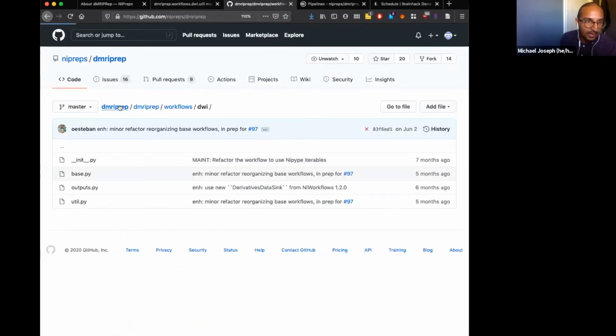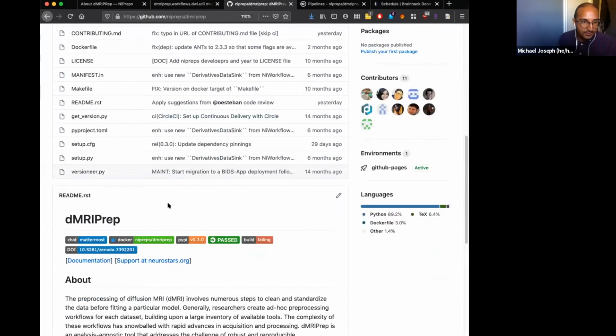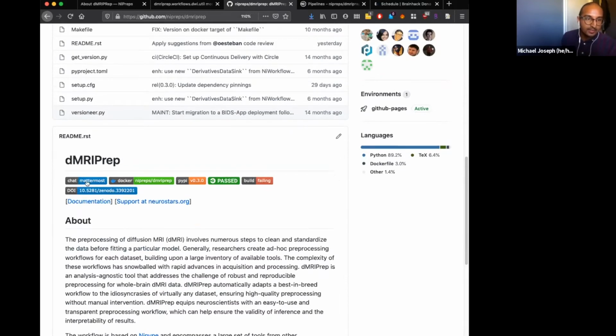I'm going to go back to the main page now, and I'll head to the README. We have a couple different routes of communication for dMRIprep. If you want some immediate feedback, or you're wanting to contribute and not sure where to go, you can find us on Mattermost. If you are signed up for this brainhack, you might already have a Mattermost account, but you can find us in the dMRIprep channel.